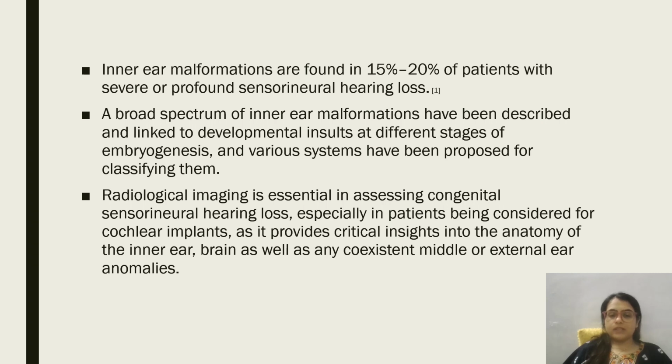Radiological imaging is essential in assessing congenital SNHL, especially in patients being considered for cochlear implants, as it provides critical insights into the anatomy of inner ear, brain, as well as any coexistent middle or external ear anomalies.